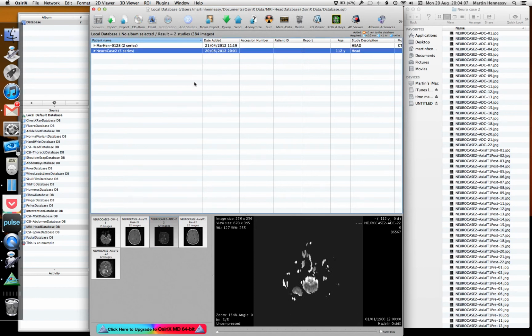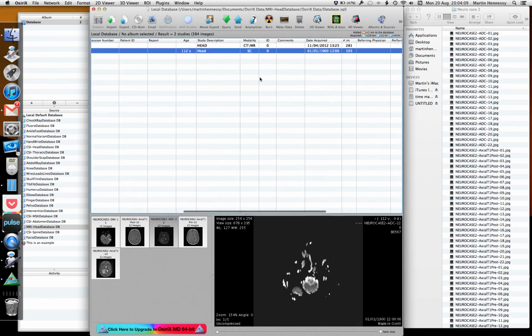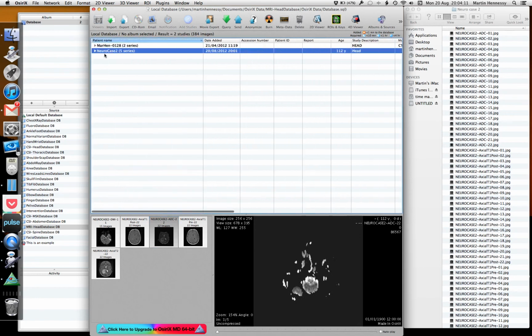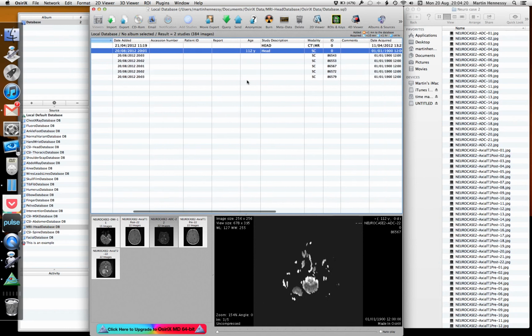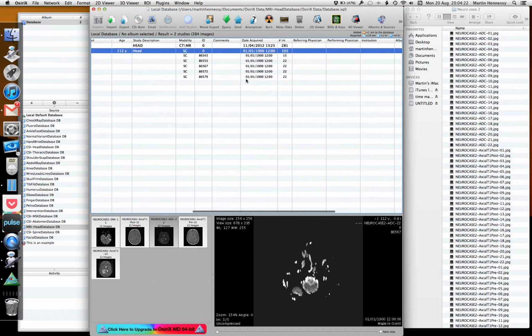So I was thinking about how we could go even further, and I think we could use the anonymize tool for this. So as you drop them down, is there a way of changing the series name?